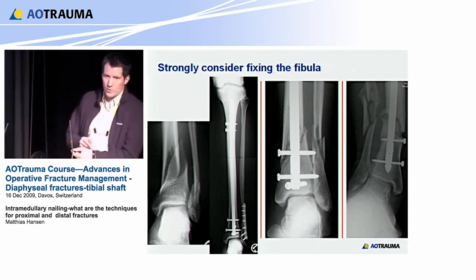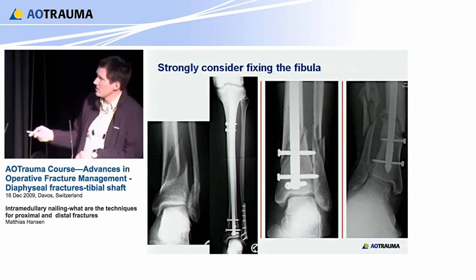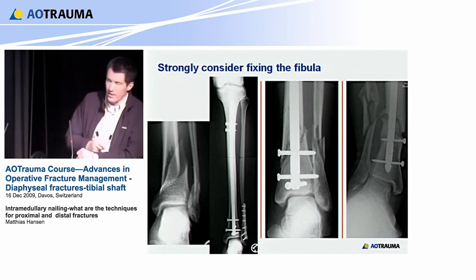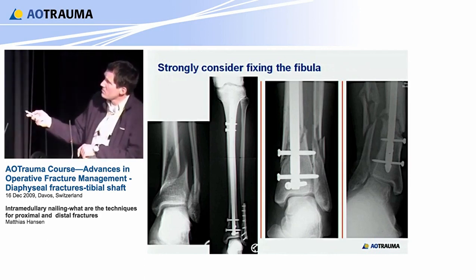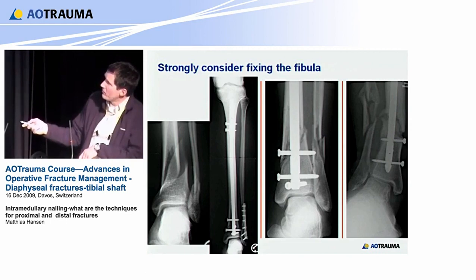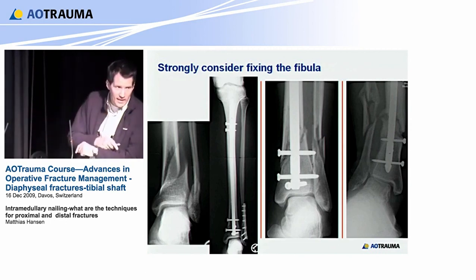If ever you treat these distal tibial or lower leg fractures, consider fibular fixation. You see a distal lower leg fracture, the fibula is fixed and anatomical reduction is obtained. In this rather similar case, you have a slight valgus malalignment, still acceptable and fixed stable by the 4 interlocking options of this nail.